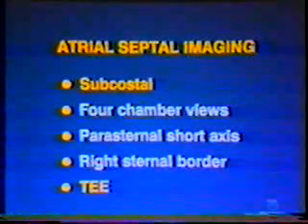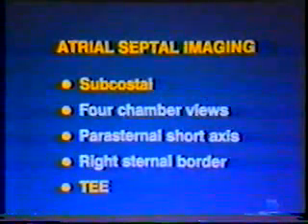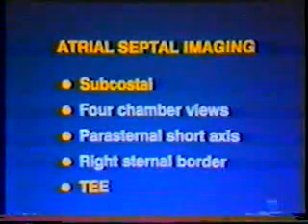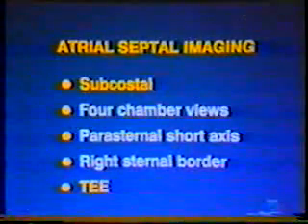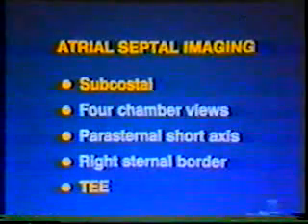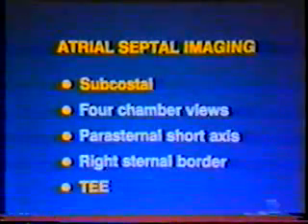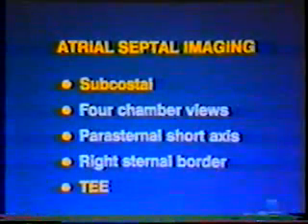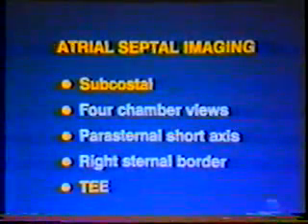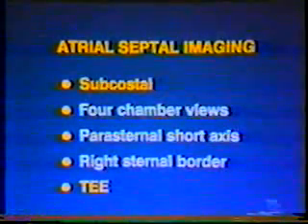In patients with enlargement of right-sided chambers, the right parasternal window can also provide excellent visualization of the atrial septum. Recently, transesophageal echocardiography has provided a new window to the heart, and in particular to visualization of the atrial septum. Proximity of the esophagus to the atria provides high-resolution images of various atrial septal defects and even permits visualization of patent foramen ovale.